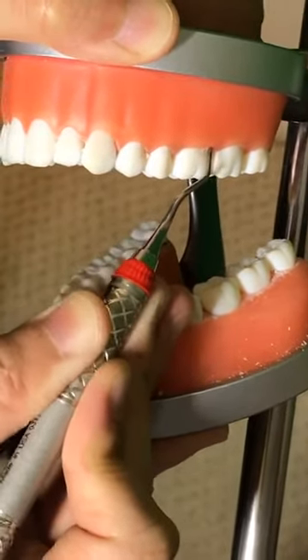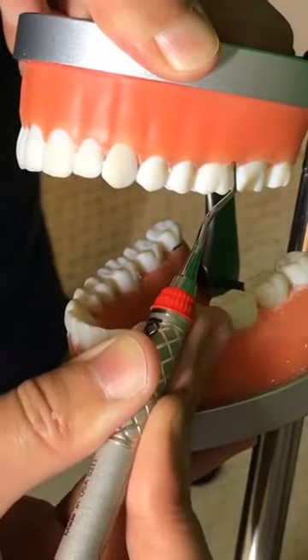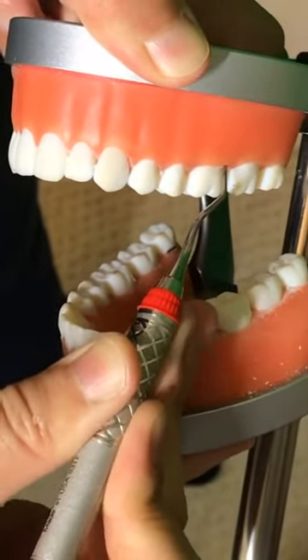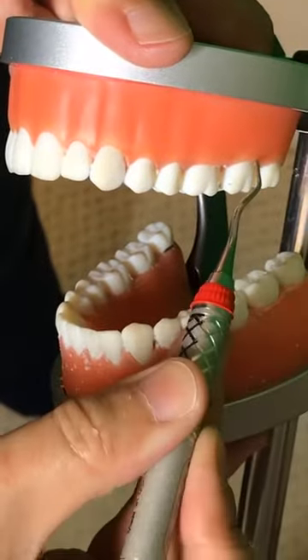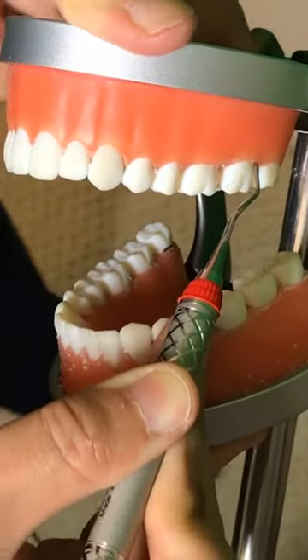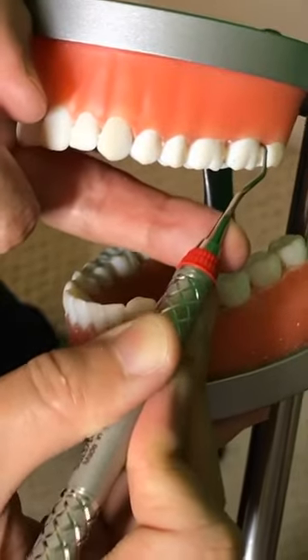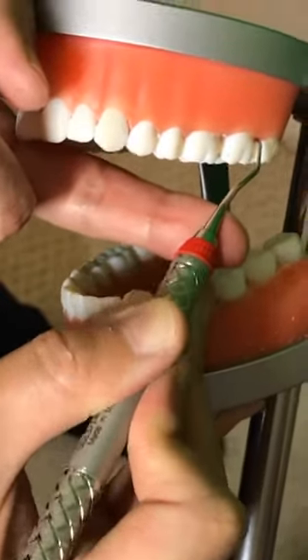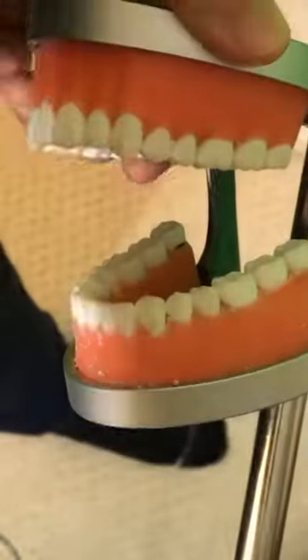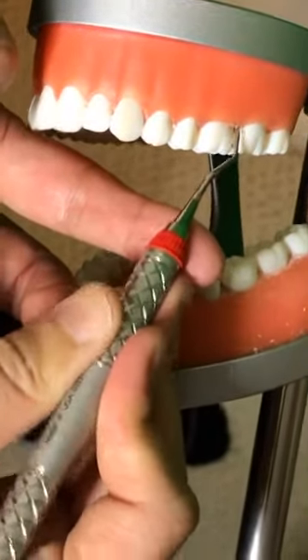So extra oral, if you are practicing every day, I want you to practice extra oral on the distal of the maxillary. Again, this is a weak spot. Your thumb is giving the lateral pressure, and your middle finger. If necessary, you can use reinforcement from the back, from the distal surface to the tooth surface. This is a little wobbly here. So today is the 13/14.